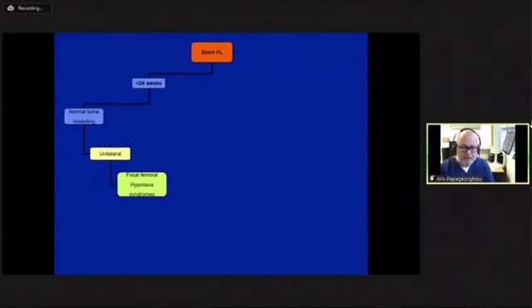Here I talk about focal femoral hypoplasia because we started our problem with a short femur, but you can have focal hypoplasia of other long bones as well.